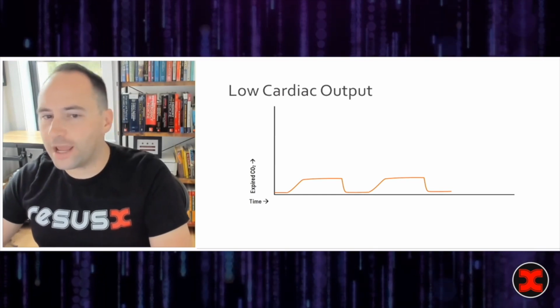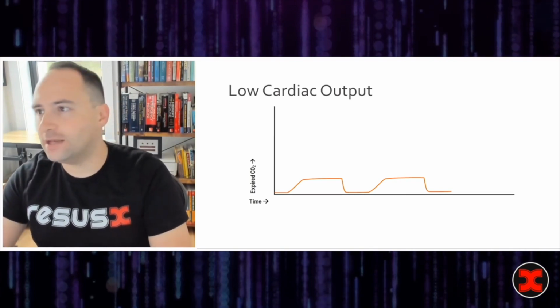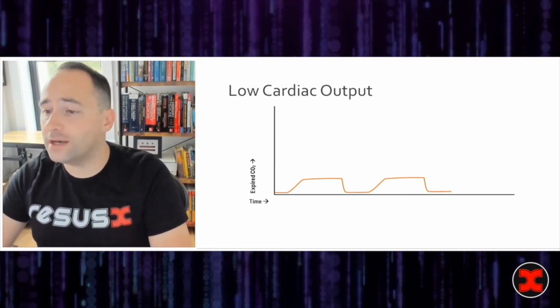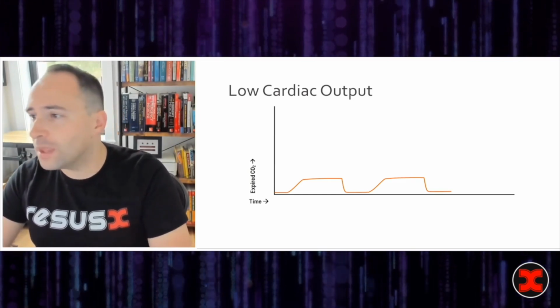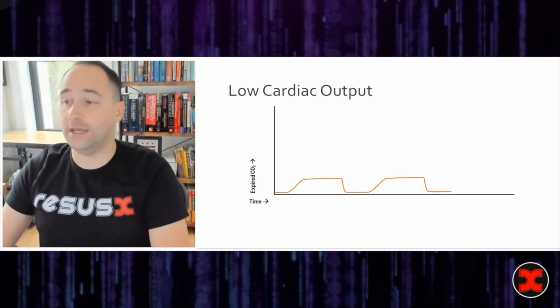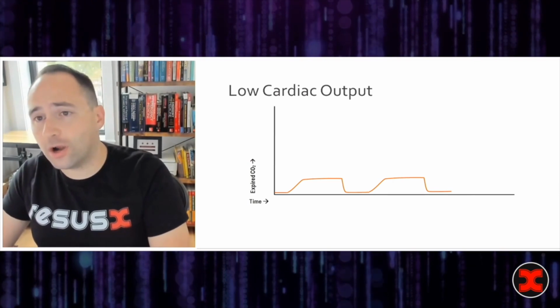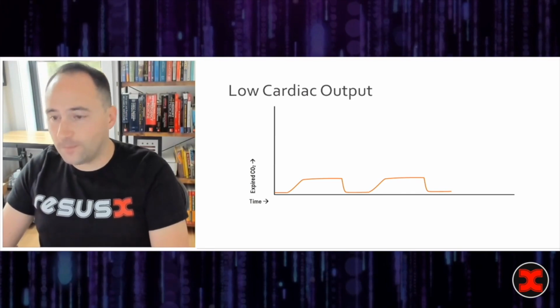So this is the state of low cardiac output. And in the state of low cardiac output, we think about the end-tidal value acting like a cheap A line. So you can see here how there's a relatively depressed plateau. Each phase of the end-tidal waveform looks approximately normal, just the end-tidal value is pretty low. This is seen in any state of low cardiac output, whether it be left-sided heart failure or, for example, pulmonary embolism, which has low CO2 for a couple of different reasons. Once you start to augment the cardiac output, your end-tidal capno will respond in real time by increasing its value.